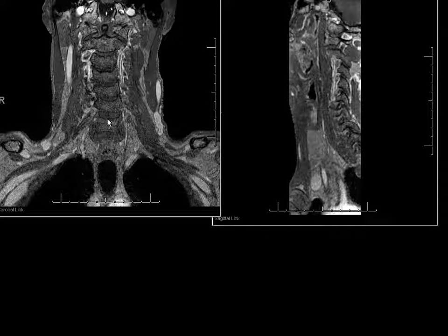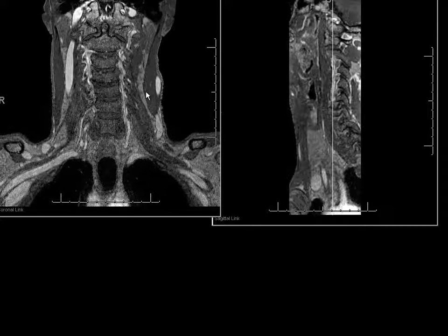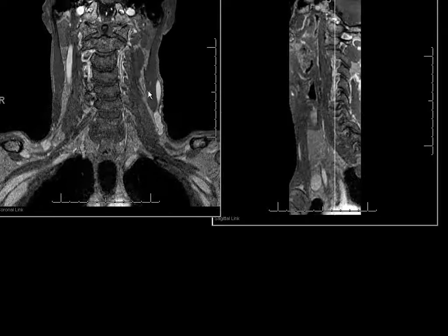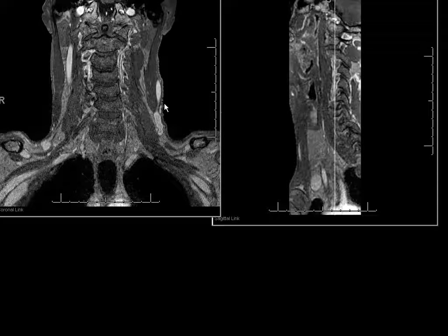So this case is a congenitally small left vertebral artery that does not have the power to pump all the way to the PICA. So the PICA was filled through the contralateral side, but the left side was still supplying something. It's not occluded, and this demonstrates the utility of this intravascular agent.